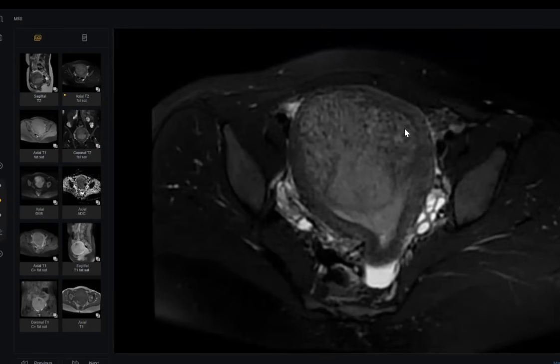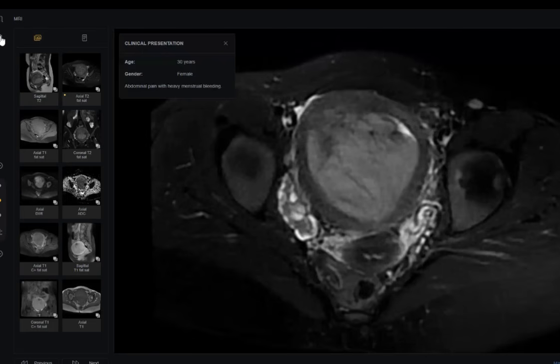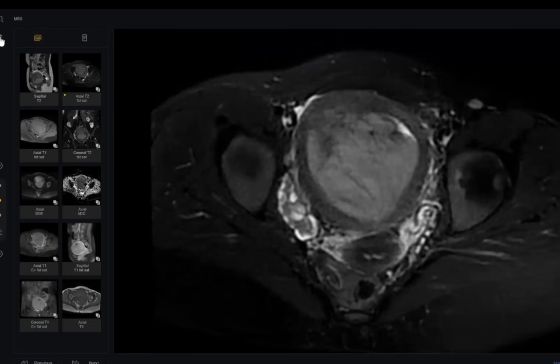Endometrial. Excellent. So, what's your differential diagnosis in this age group? Give me a suitable buzzword or a suitable differential. Maybe endometrial carcinoma. It could be endometrial carcinoma, endometrial polyp, or submucous fibroid. These look like the differential. Is it malignant or benign?